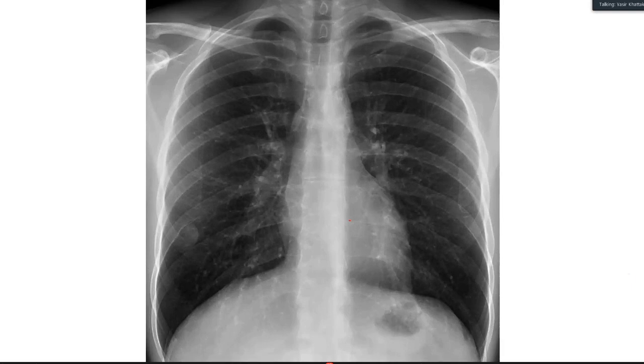Now, this is why I put up this case for you, because some people will call this a solitary pulmonary nodule. Now, companion findings are very important to look for. When you see one abnormality on an X-ray, you always look for others. It's called satisfaction of search. So you survey, and you survey the adjacent bone. You see, we just saw a case. Did you see the previous case? Were you there? Yes, sir.